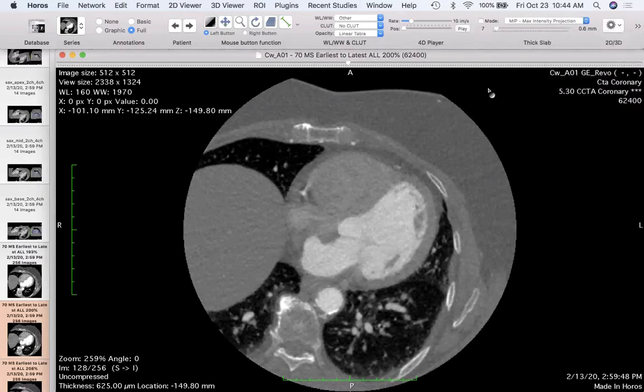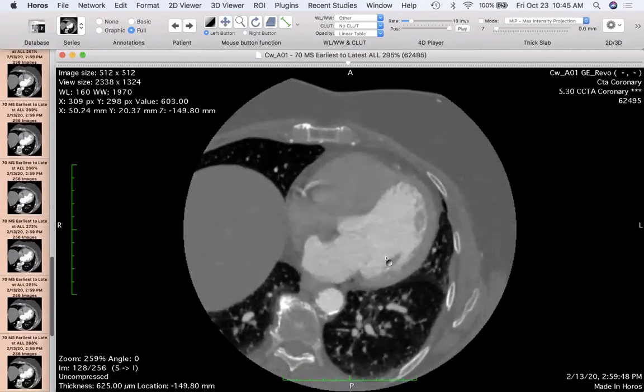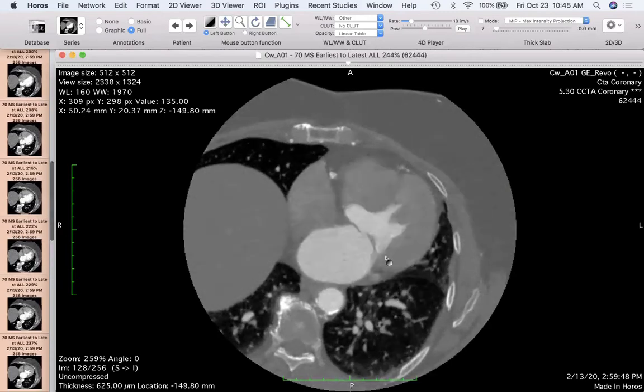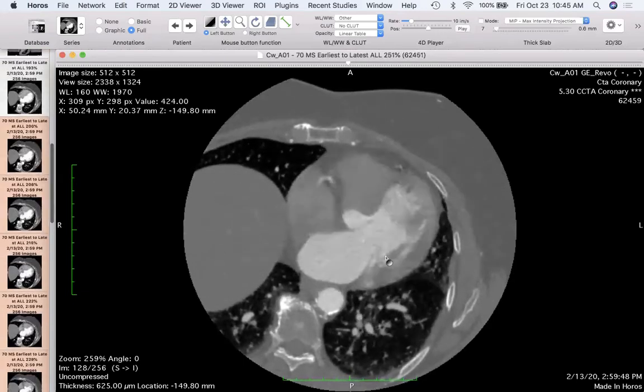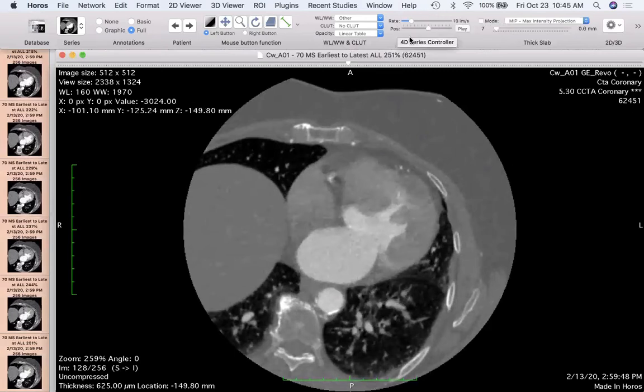Oh, first, remember I downloaded, I don't know, 14 timeframes or something? If I do the up and down arrow on my computer instead of the left, right, first make it active, I go through time at that slice, right? So now I'm staying in the same slice in the patient, and I'm looking at all those different time frames. And if I just hold the button down, I can watch a movie. So that's my down arrow. I'm going forward in time. And you can see that this is playing forward in time.